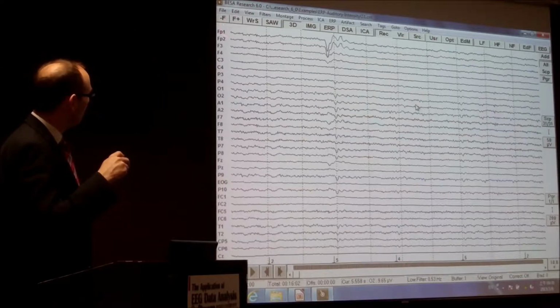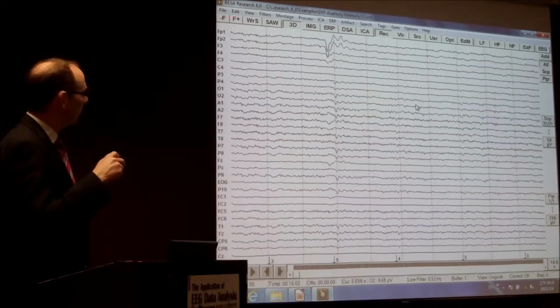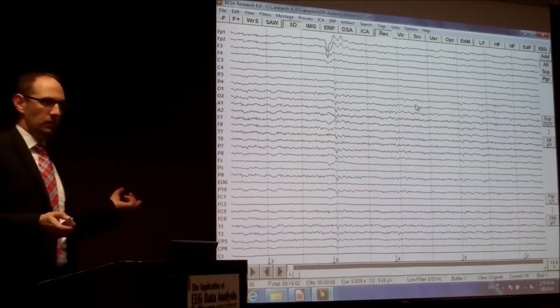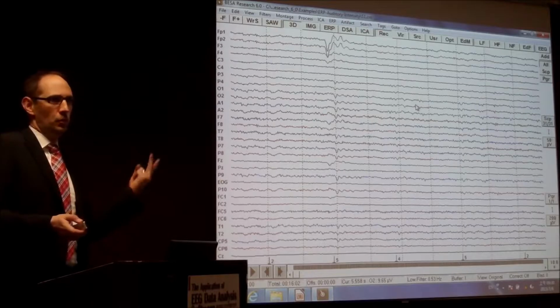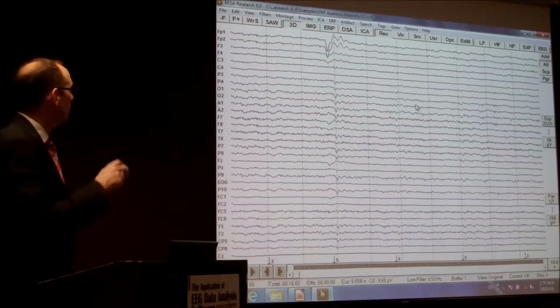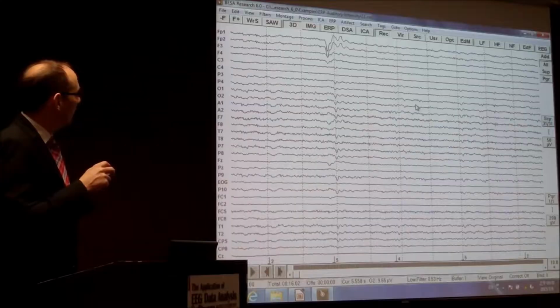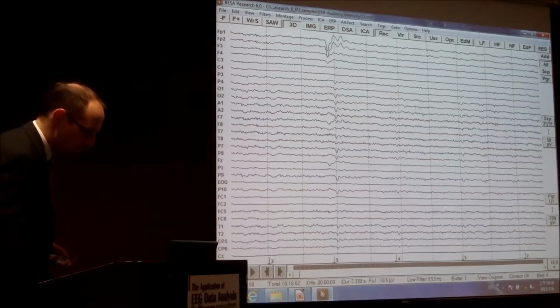What we have up here, we have some buttons. F plus, F minus is to toggle between different files you opened. So if you have two files open, you can toggle just between the files. Then the other buttons I come later on. Then we have the DSA button. I can show you what then happens.